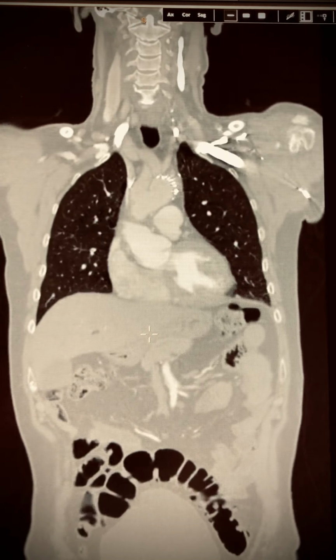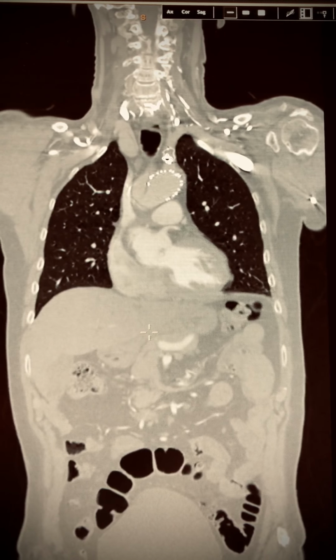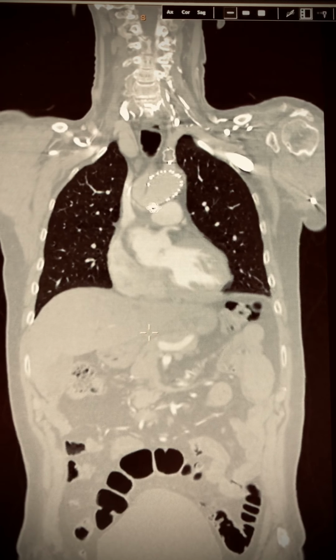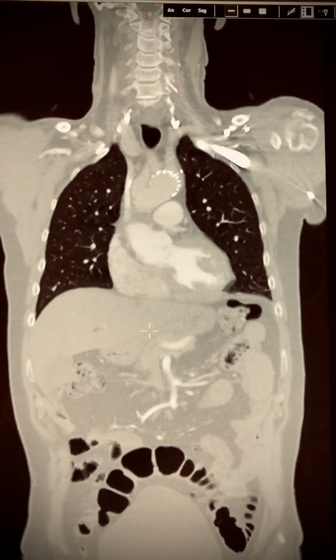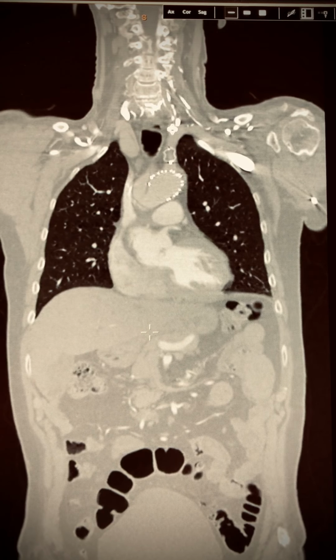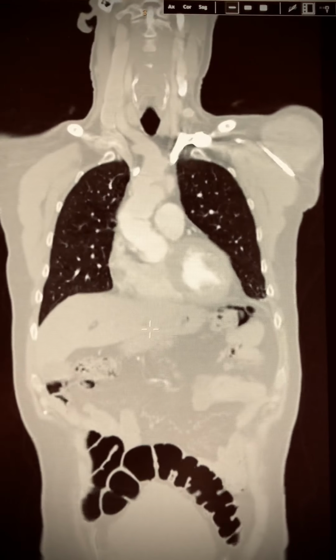This allows the ostium of the left subclavian artery to be first occluded with an Amplatzer plug, then the thoracic endovascular repair can be successfully deployed beyond this region. Another important point to consider is the supply to the vertebral arterial system, and the plug should always be proximal to the vertebral arterial origin, such as in this case.